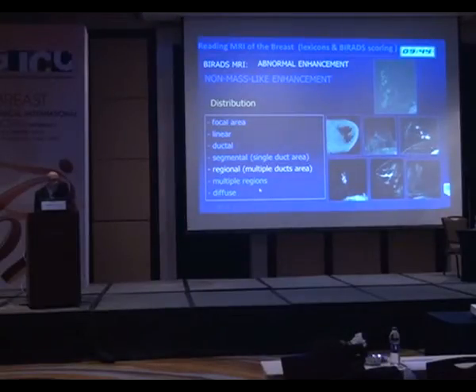Sometimes it's not so clear if they are one type or the other, but it's just to understand that we see a lesion like this one is not a 3D lesion, or an area of enhancement like this one, some small spots together that can be a sign of in situ carcinoma, ductal carcinoma.